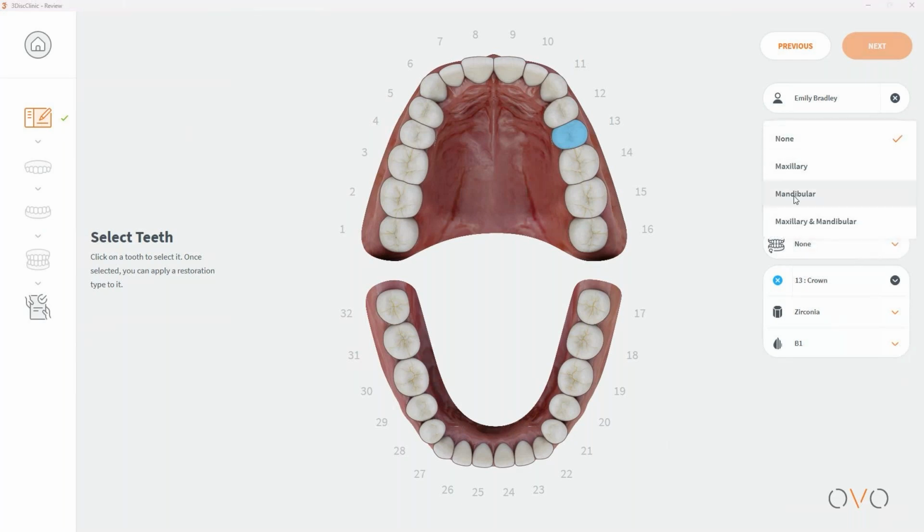This option here allows us to select a pre-op scan. So if I wanted to scan the patient's teeth prior to being prepped, I could select, let's do it for the maxillary scan. Over here on the left-hand side, you'll see that I now have two maxilla scan stages. I will scan once in the pre-op scan, and that file will be duplicated in the post-op scan stage, which will then allow me to make changes on the scan data. So for instance, I could cut out the area that was prepped and scan the prep into the scan data. For the sake of the demo today, we'll deselect the maxillary scan.